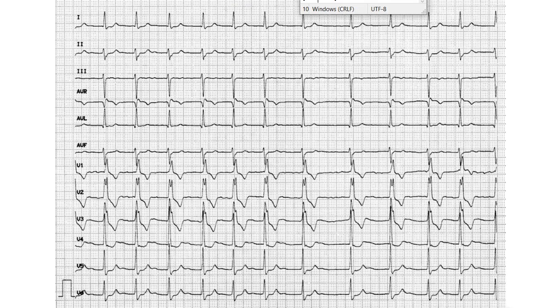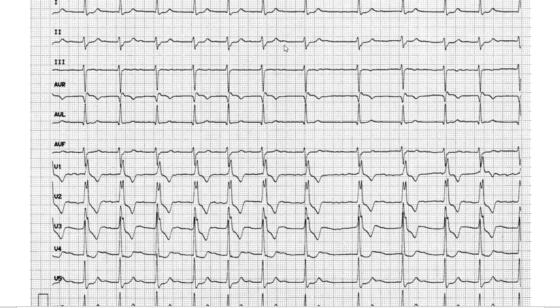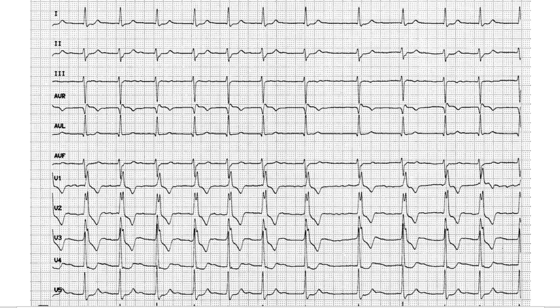This is the RR. This is irregular. Instantly. Point 1, irregular. Extrasystoles, question mark. No extrasystoles. Might be checked through the leads. You don't see anything irregular popping out. Point 3, heart rate. You calculate. Point 4, I keep forgetting point 2. I don't see P waves. I don't think I see P waves before everything in lead 2. I mean, this might even look like P waves. However, I don't really see them. There is none here. There is none here. I don't think that's a P wave.